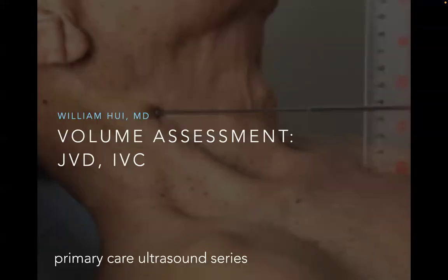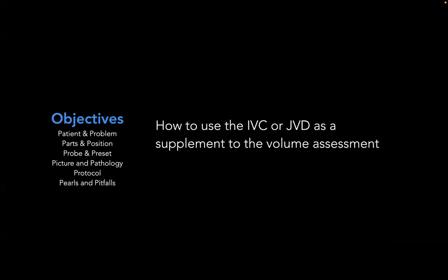Okay, so lastly, we're going to be talking about volume assessment, JVD and IVC. The objective is how to use the IVC or the JVD as a supplement to your volume assessment. Now, this is particularly useful in the inpatient setting, but I can still see some use case scenarios in the outpatient setting. For example, when you're seeing someone who's coming in after an ED visit or hospitalization for heart failure, or in someone with long-standing ESRD and you're worried that they're fluid overloaded.